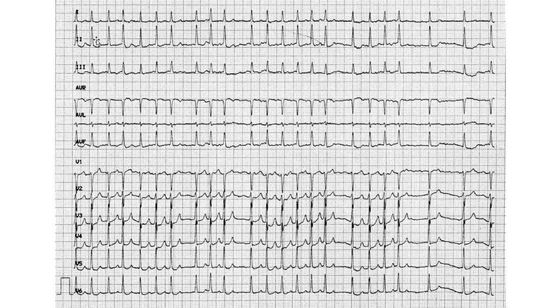Alrighty. So regular or irregular. Clearly there are gaps here. This is irregular. Point 2, and you use the pad to check out, but I can tell you from now it's clearly irregular. Point 2, sinus or non-sinus, I can't really tell easily. However, empty spaces, here I can't really tell any P waves.